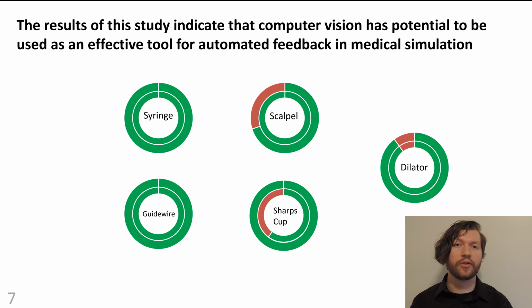Future work will be done to improve the algorithm, to develop methods to assess proper step order, sharps management, and sterile technique, and to integrate computer vision into current simulation systems.